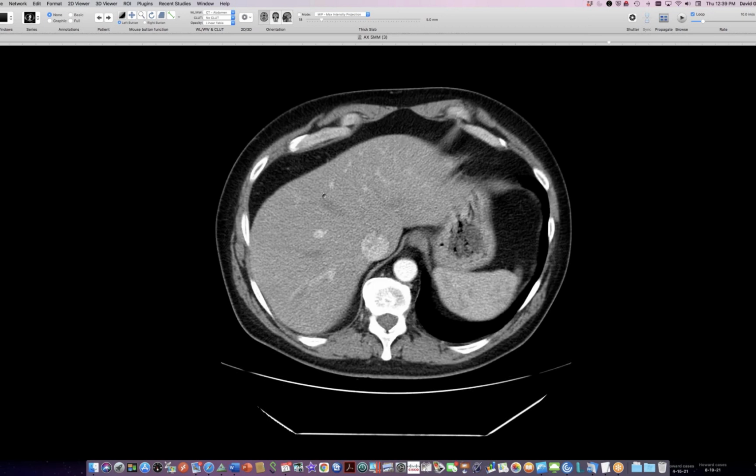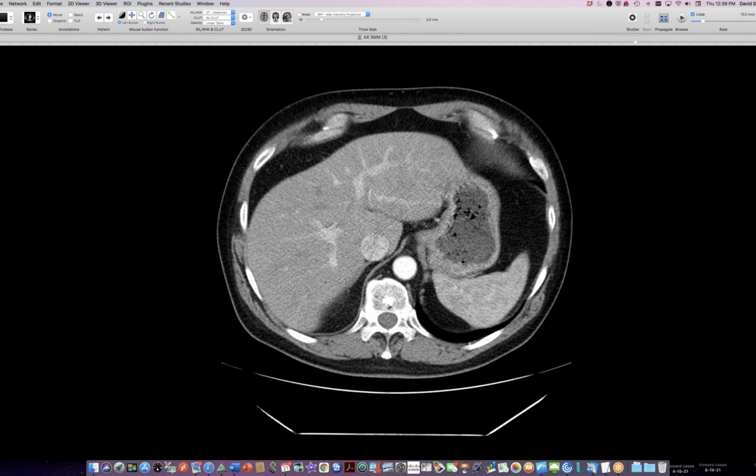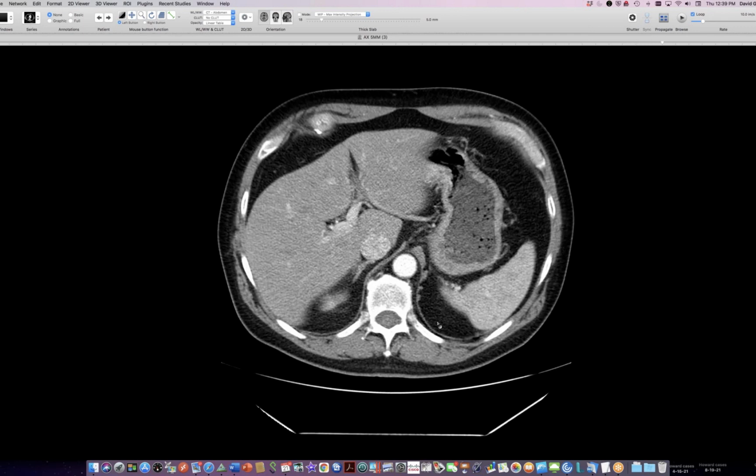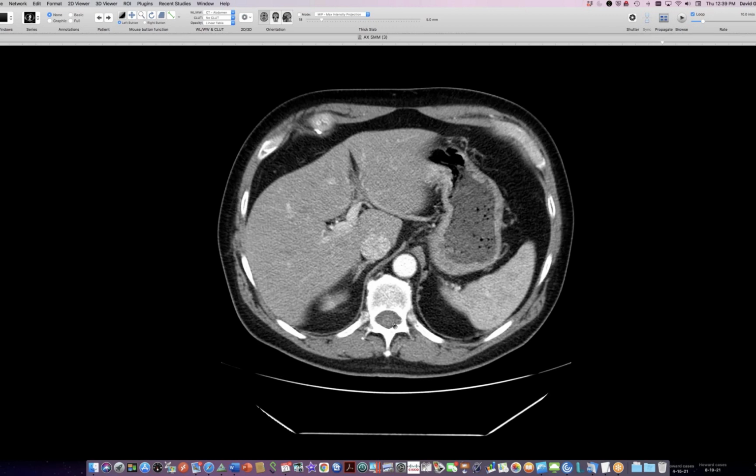You can see that there is some modest thinning, but not really the same degree of atrophy that we saw in that last case. Normally the posterior muscle on the right crus is thicker than the left. And you can see that in his case, that is not true. The left is thicker than the right. So this is abnormally thin. It should be thicker on the right than the left. So his is not that way. So he does have this thinning, but it's not really complete atrophy.